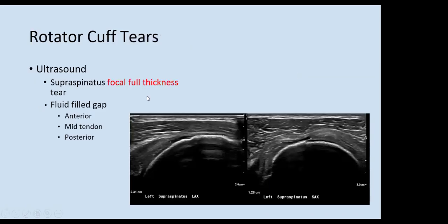In the previous few examples, we looked at the partial thickness tears. We talked about the partial thickness articular, partial thickness bursal. We also talked about the concealed interstitial delaminating tears. Now we move to a different group of rotator cuff tears. We call them the full thickness tears.